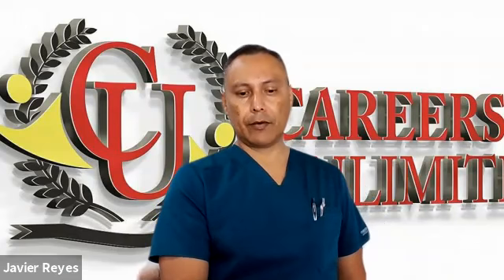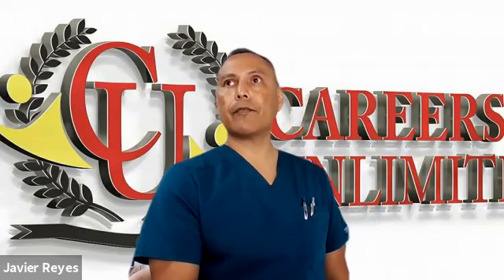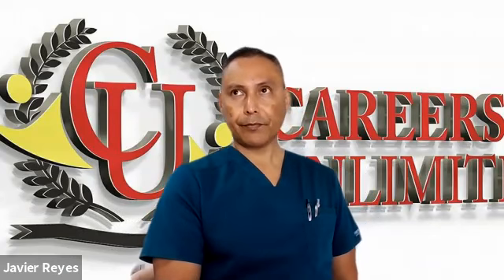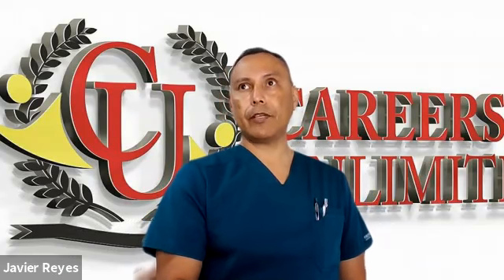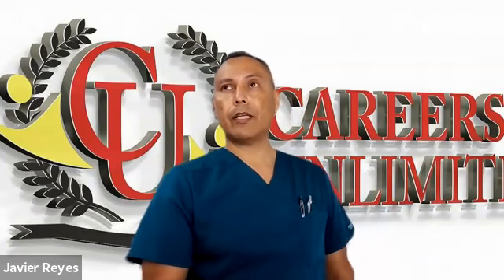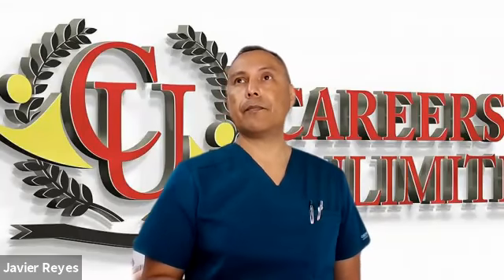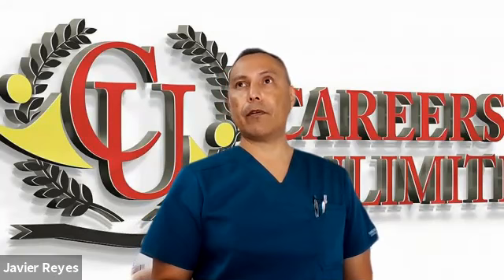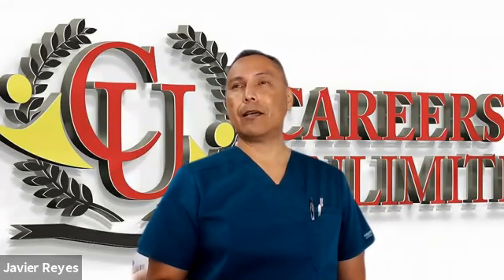What would be the rate on that one? Are you able to determine a rate? Let's say it's a regular rate. Remember to use the methods, the 300 method or the 1500 method. You count the big squares or the little squares. If you count the big squares, you divide them into 300. If you count the little squares, you divide them into 1500. So we count the big squares: 1, 2, 3, 4. 4 into 300 gives you about 70 some. Or no, actually it's lower than that. 300 divided by 4 is about 72, 73.